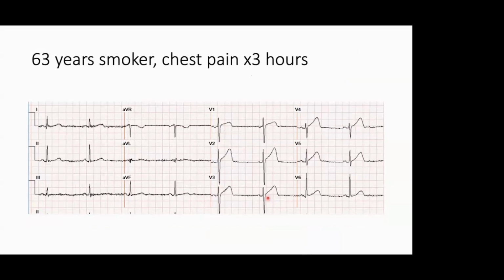So that's okay. Then this is a 63-year-old smoker with chest pain for 3 hours. Any specific findings in this patient? Is this normal or is this anything abnormal? Bradycardia. Yes, bradycardia.